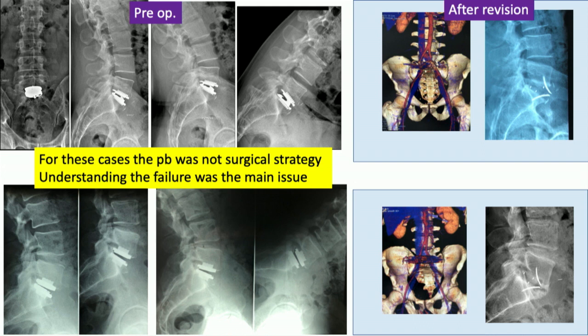This is post-op X-ray. You see, we did anterior approach. We do currently this type of CT scan to see the vessels and to see if we have abnormalities, and we had no problem to revise. It is not the question for us in those two cases. The main problem was to analyze those two cases.